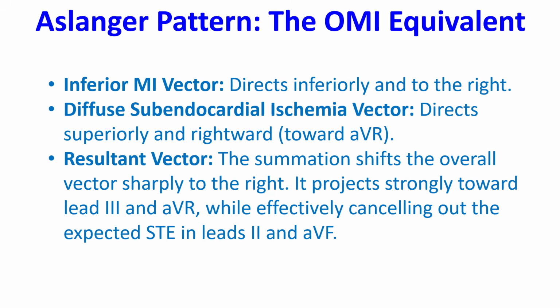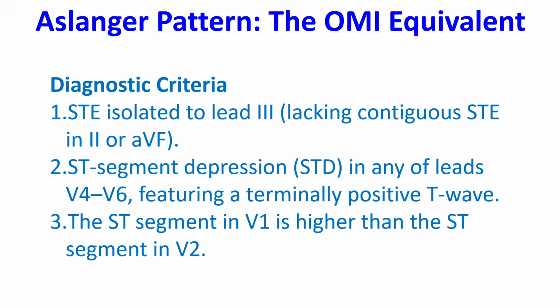It projects strongly towards lead 3 and AVR while effectively cancelling out the expected ST elevation in leads 2 and AVF. Diagnostic features: ST elevation isolated to lead 3, lacking contiguous ST elevation in 2 or AVF. ST segment depression in any of leads V4 to V6, featuring a terminally positive T wave. The ST segment in V1 is higher than the ST segment in V2.